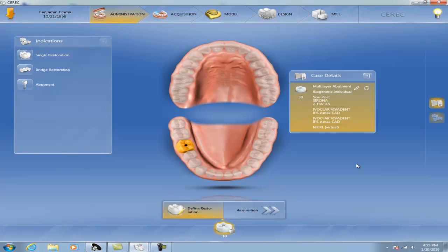In today's video is how to design implant crowns. What's the difference? What are the steps? What's the difference between 4.4 Chairside software and the previous software? So in the previous video, we discussed how to designate the implant crowns in the software.